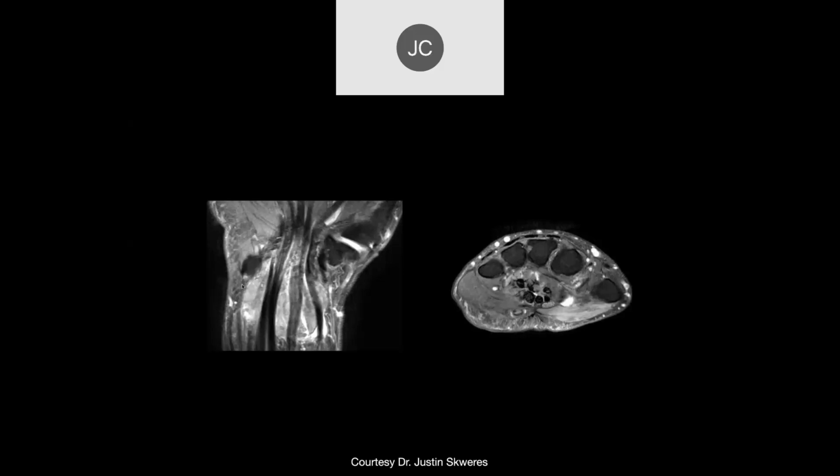Rheumatoid arthritis is certainly a little different than I've typically seen in the past, rheumatoid arthritis involving tenosynovitis, but this could be tenosynovitis. But weird things that don't look like they have a lot of necessarily edema, though they can. But you get soft tissue thickening both within tendons and within the tendon sheaths. Always think about gout. And in this particular case, this is all gout involving the synovium of the flexor tendons, which is leading to carpal tunnel syndrome in this patient with gout.